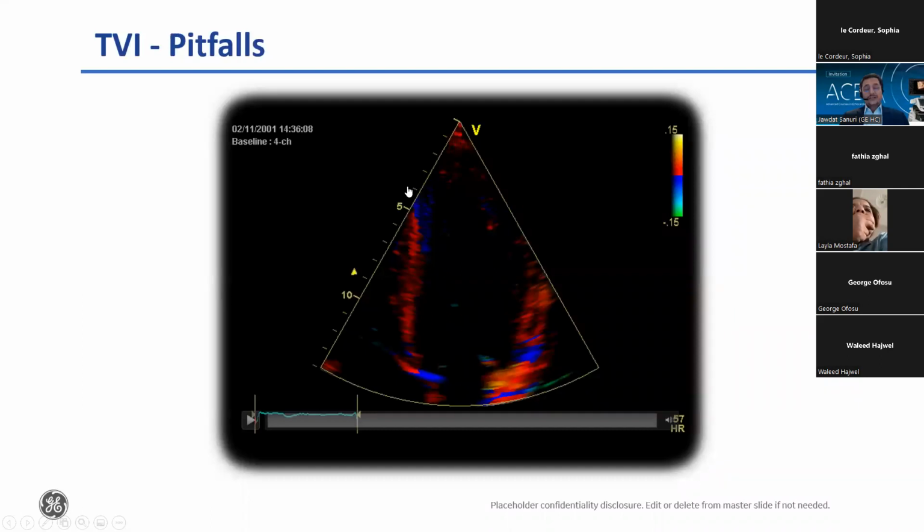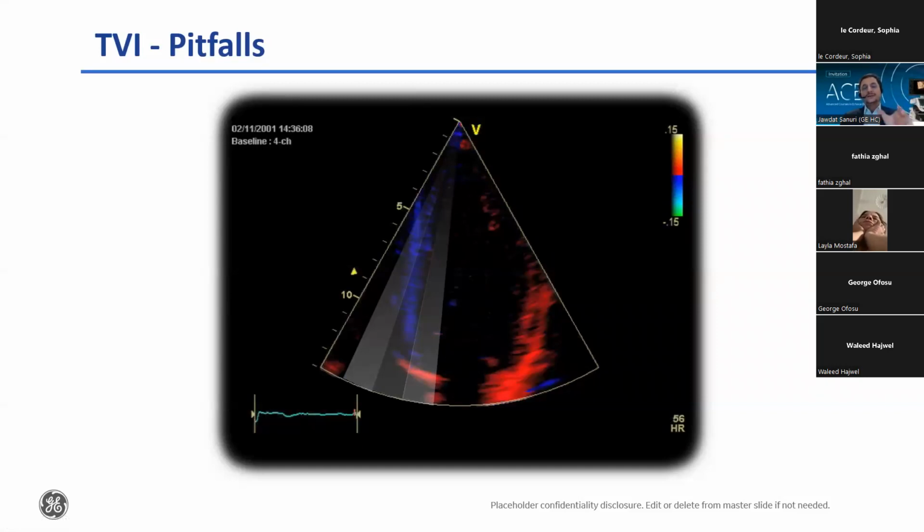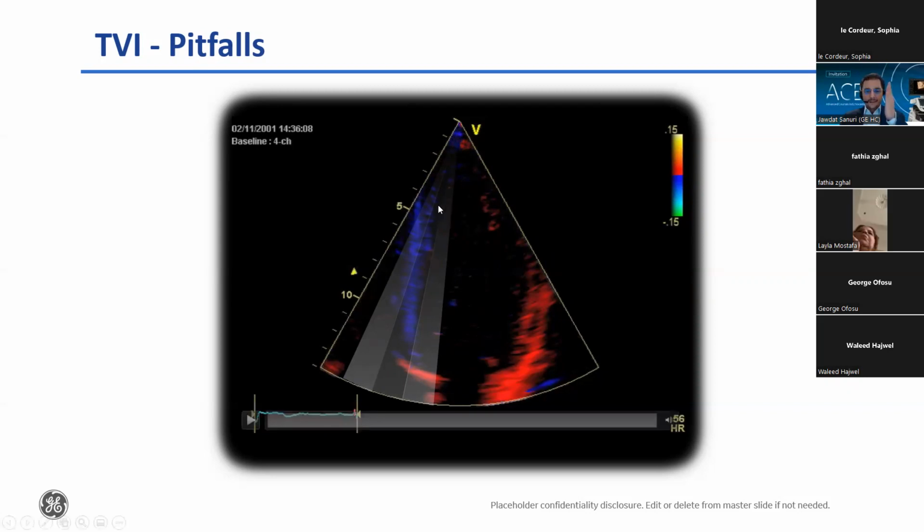However, tissue Doppler, again, as I mentioned earlier, the first thing, it has a pitfall, which is the angle dependency. So on the same image here, if you are looking at the velocities and the strain and any value between the line here and the line here and the line here, you have different angulation. So for example, in the line here, in this apical segment, you are actually not only picking up longitudinal strain because the apical contractility is in this direction longitudinally, but also you're picking up radial velocities, which means you are mixing the two. And of course, radial velocity and radial strain, or radial strain predominantly, has actually an opposite value, because longitudinal strain during systole is actually negative. Radial strain during systole is actually positive. So they can intervene with one another.